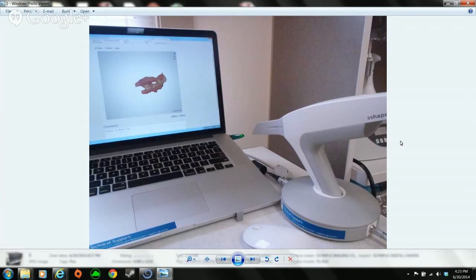Sometimes it's just a particular shape of people's teeth, especially if they have other crown and bridge work around it, or implants, which can be kind of bulbous and have really large undercuts. And if your model's small, if you try to remove the undercuts, it will take away too much and you won't have enough guide there, if that makes any sense. It's just the way that machines see in straight lines. So you can choose not to remove the undercuts and just trim down your guide manually with a handpiece.